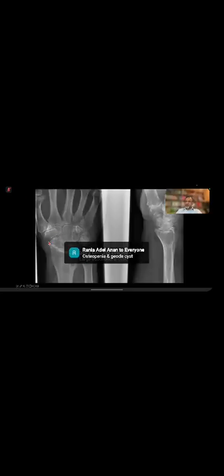Okay, sorry. So you can see that there's arthritis in the rest of the joint, but the radiocarpal is still involved, typically the radioscaphoid. Joint space is reduced, but no significant migration. But this is a large geode here, and yes, a little bit of SLAC as well, but a large geode in the distal radius. And we did an MR scan.